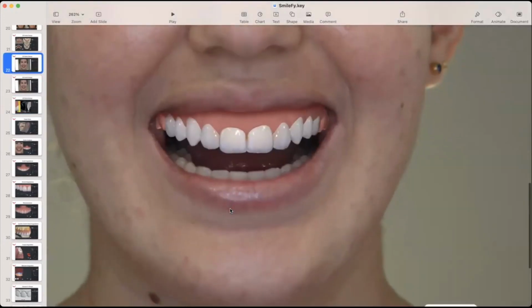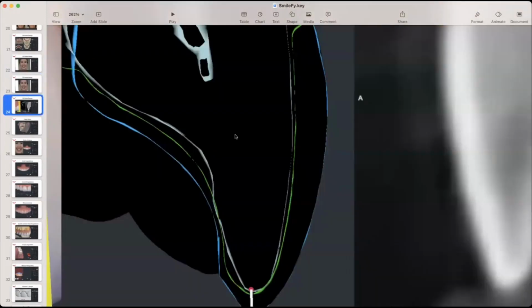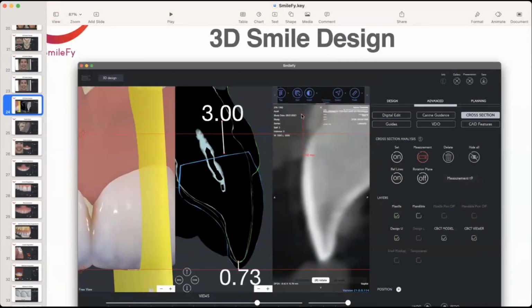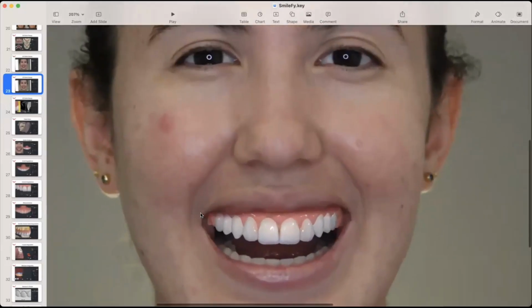We can create really complicated cases like this one, where she was just, oh, I want new incisal edges, and when we designed, we could visualize the correction of the incisal edges. But if we consider the CBCT file, we measure the bone margin, we measure the soft tissue, and we create the biological width with the crown lengthening, that's the result that we can offer her, right?